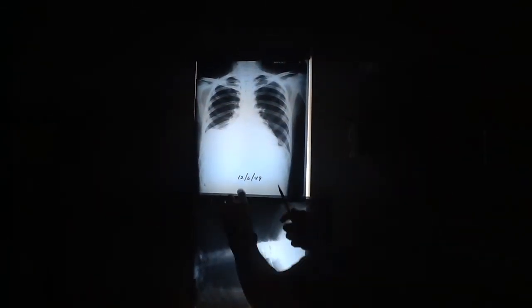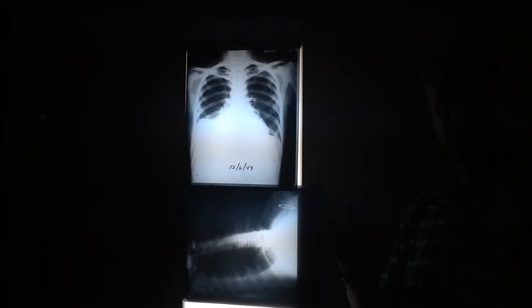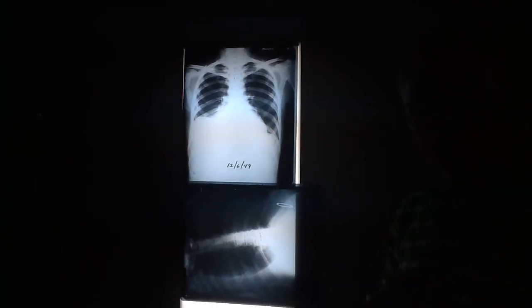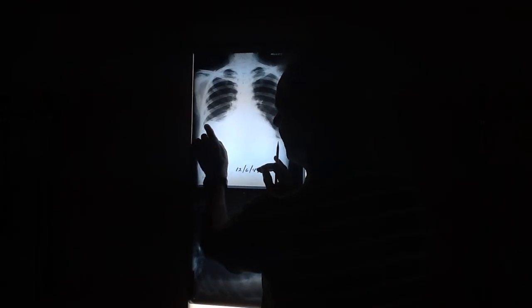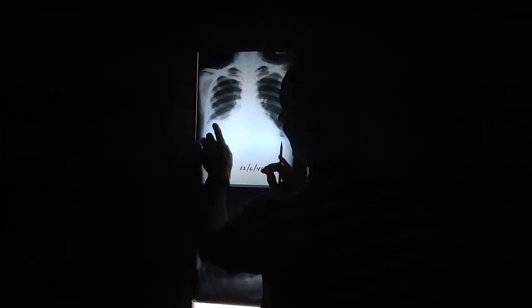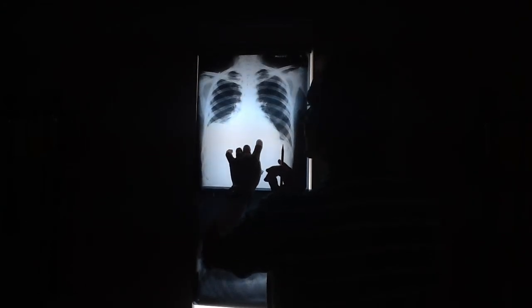In fact, we have one in either the A or the B labs that has it with a pneumoperitoneum, which makes it really easy to see. It shifts though. You see how the apparent dome of the diaphragm is shifted lateral? Because it kind of goes up and then looks like it would come down this way. That's not the typical way a diaphragm presents.